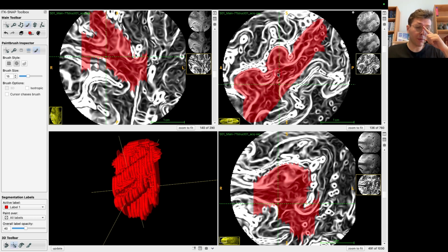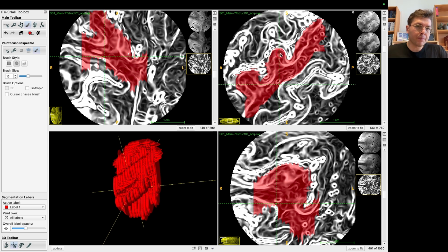At 0.175 millimeter nominal resolution. And once we later compute layers and other stuff, we will know exactly, because we did the full quality control, full segmentation, and we will know the geometry very well in our subjects. And at the end of the day, you spend a day for one subject, I spend a day for another subject, and we have, however, 10 subjects in total. In a couple of months we are done. Not even doing it every day, I mean.